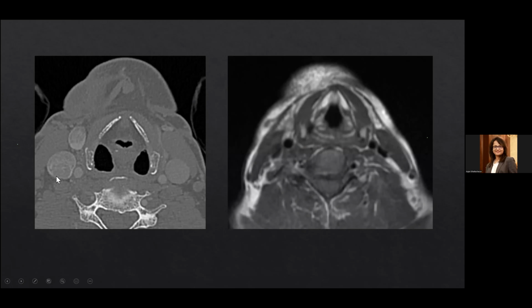So this is one of our patients. We can see this is an oral cavity carcinoma, but we are able to identify the anatomy of the thyroid cartilages very nicely. What we are seeing is that this part is the non-ossified part, which has the same density as the muscle. This is the bone window in which we are looking. And these are the ossified parts of the cartilages. The fatty part appears hypodense in the center, and the cortex appears hyperdense.